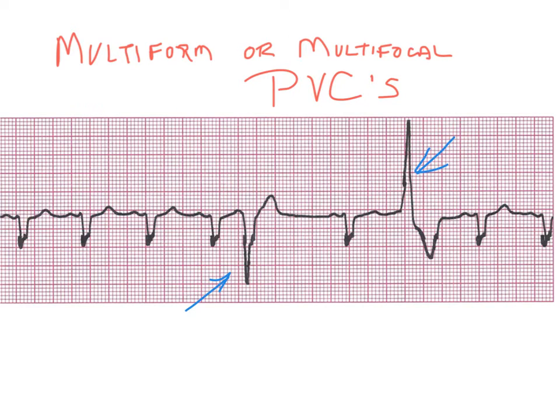A couple other things are happening here if you really want to look at this rhythm as best as you possibly can. We are actually looking at a rhythm here that is falling on what we call an R on T. I'll show that a little bit more to you here in a little bit. R on T phenomenon here.